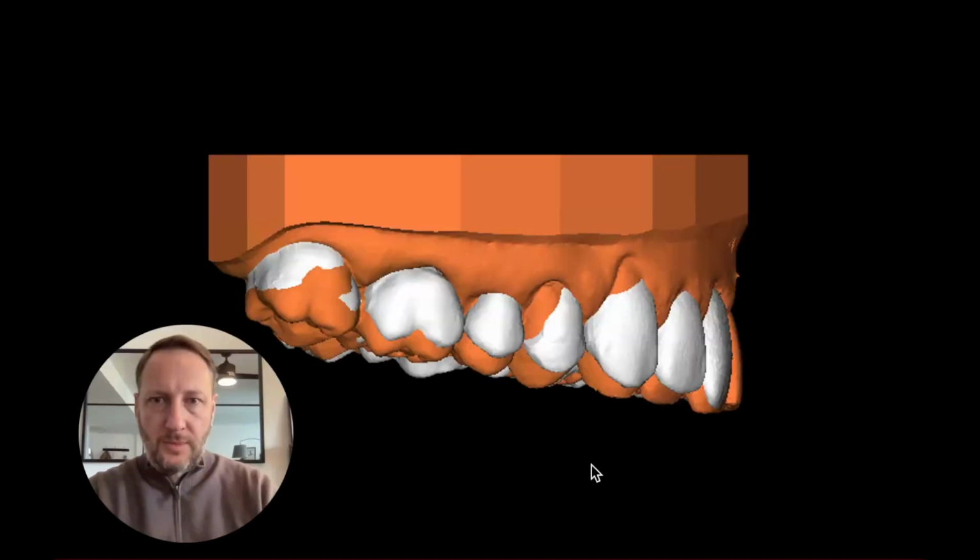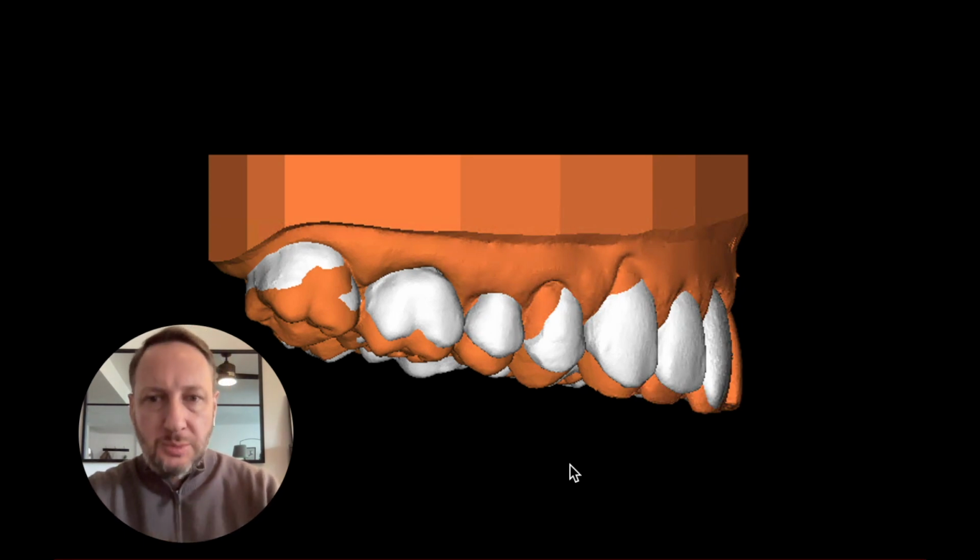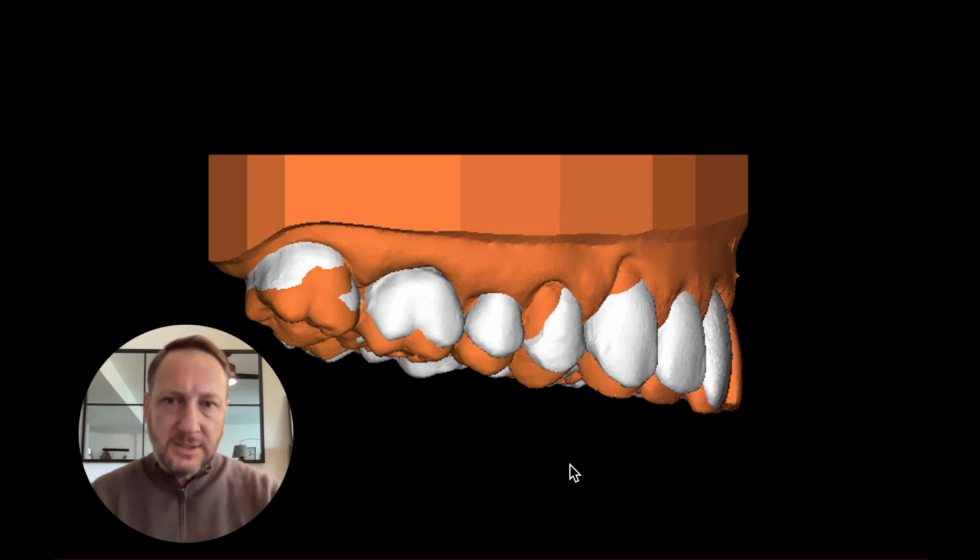Quality Control. The Post Ortho Quality Control is a moment where we can brainstorm again about what we need to do with the case, if it's possible to finish with orthodontics, or if we need more ortho with an additional set of aligners. And the best way to do this is creating this visual content, this overlapping between the models. So we have here the initial model, now in orange, because it's not the actual model anymore, so now it's a different color.